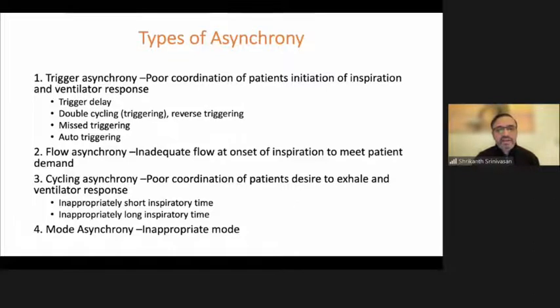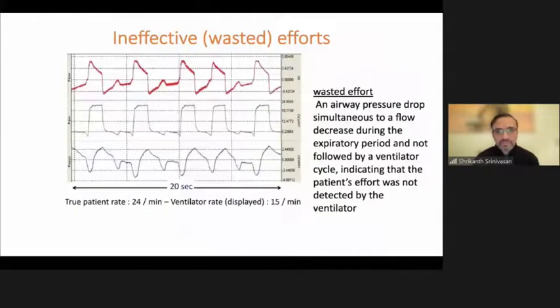And finally, we can come to mode asynchrony, which corresponds to inappropriate mode, which is not ideal for the patient at that given time. So we'll talk about all these types of asynchrony, how they appear, how the waveforms appear, and we'll take them one at a time. So let's start with the first one, which is ineffective or wasted efforts.